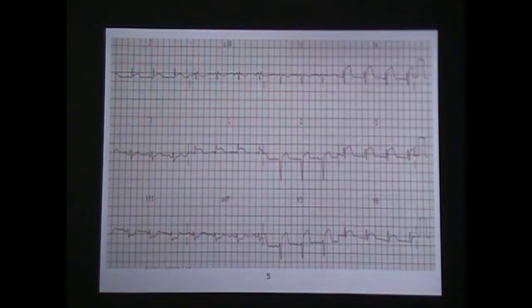Okay, so slide 5. What's your general impression looking at this? A lot of elevation. A lot of elevation going side on. Okay, so I automatically go over here just because we all start in the United States on the left when we read things. And I see this, I go down and I see I've got some here, I definitely got some here. But then I keep following that up, and I'm like, well, I've got a lot going on here.